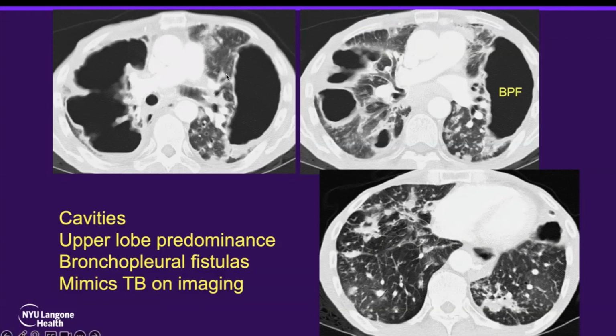And notice also how the lung is displaced. This is a thick-walled chronic pneumothorax related to communication with the diseased lung, and this was a bronchopleural fistula. And notice the multiple nodules and confluent areas. And nontuberculous mycobacteria can mimic TB on imaging given this fibrocavitary presentation.